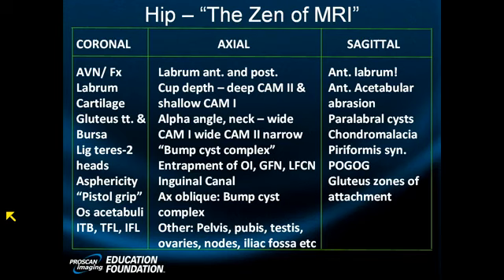We've got axial thin 2mm images demonstrating some irregularity of the anterior femur. See that in the coronal. I think that's real. It is real. There's an erosion anteriorly and down low. How about a labral tear? So far, it would be a tough diagnosis to make.